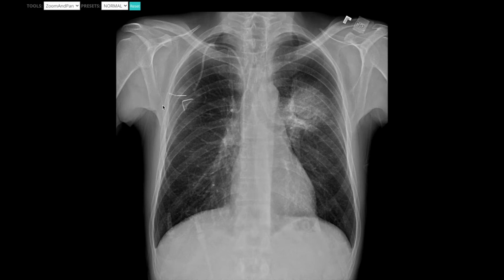But essentially, I've had a video before on just a general approach to a chest x-ray, going from the outside in or inside out, and all of those work well. What I want to talk about in more detail is how I would go through this in a live situation. Before, I had more of just a static image. But in this one, I'm going to show you what I'm looking at live and certain things to look out for.